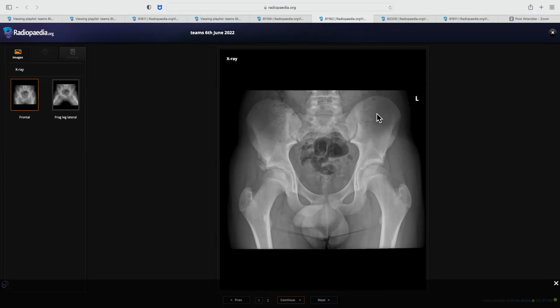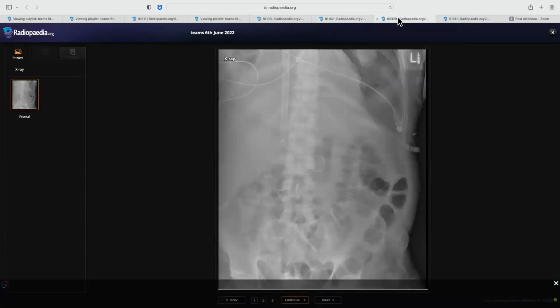Abductor femoris, sorry. Which spine did you say this is? Anterior inferior. Okay, so what attaches there? Rectus femoris. Okay, so that's an avulsion fracture. Which age group do you see avulsion fractures commonly? Athletic adolescents. Okay, so that's your next case.